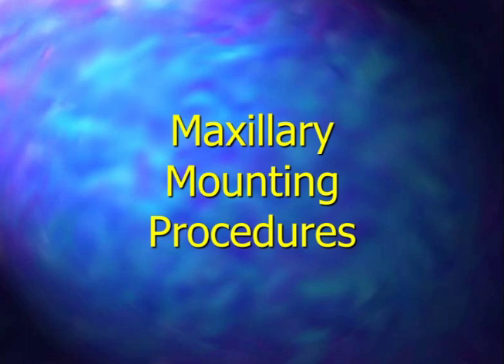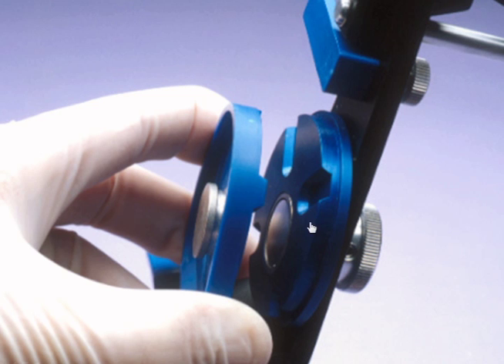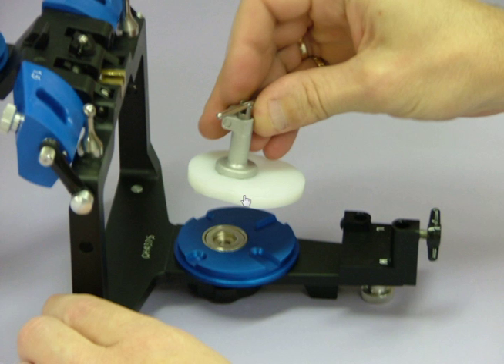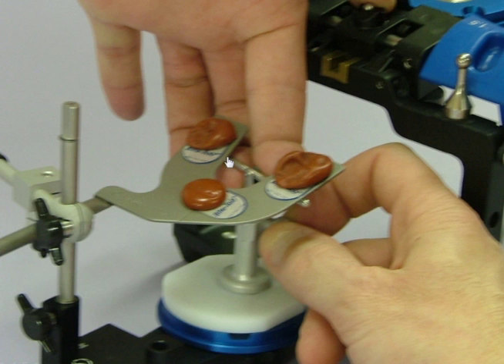The maxillary mounting procedure is we always want to set the incisal pin at 0. Then we can add a mounting plate to the upper frame. And then we replace the incisal table with our mounting fixture here on the lower frame of the articulator. And then we can add our bite fork support to the lower mounting plate. And then we add our bite fork assembly to the mounting fixture, tightening in place with the thumb screw here on the mounting fixture. At this point, we can raise the teeter-totter here of the bite fork support up underneath the bite fork and tighten in place with the screw.